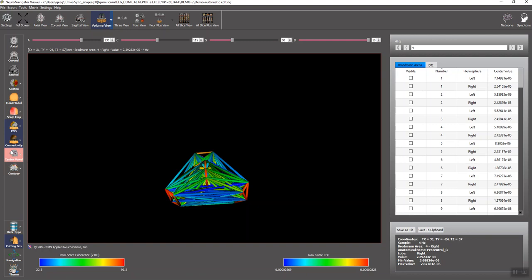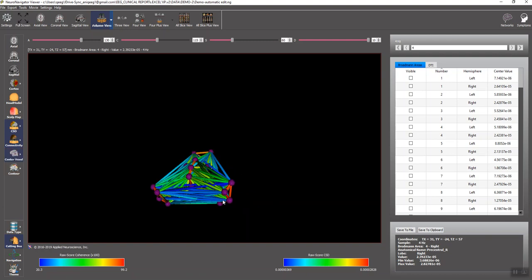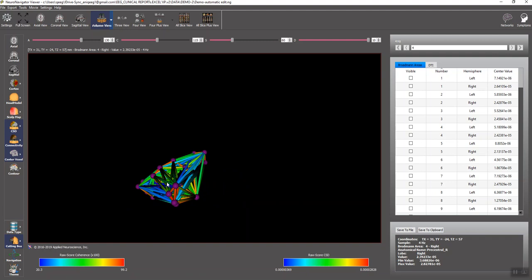And I'm going to click on center voxel. That allows one to see where things are. If you move your mouse over the center voxel and right mouse click, that shows you that cerebellum crus 1 right. That's thalamus right.